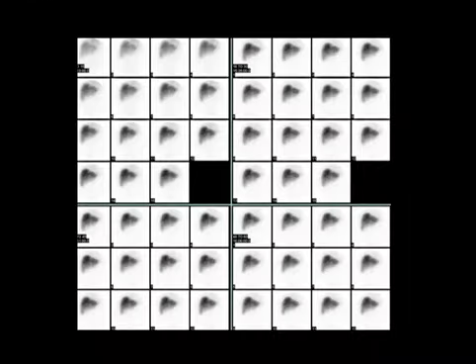Here is how it would look when you are looking at the individual images, the 1 minute per frame images acquired for an hour. Look at the first image and look at the last image. The liver takes up the tracer, but there is no excretion. This is also called the liver scan sign, because the liver looks like it would look on a technetium 99m sulfur colloid liver and spleen scan.